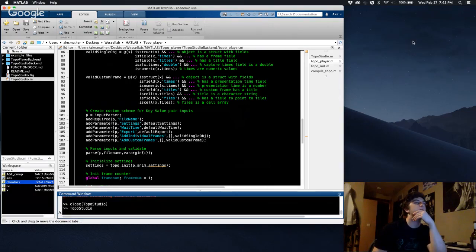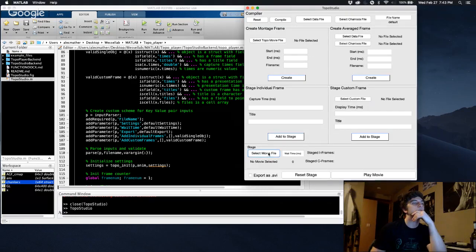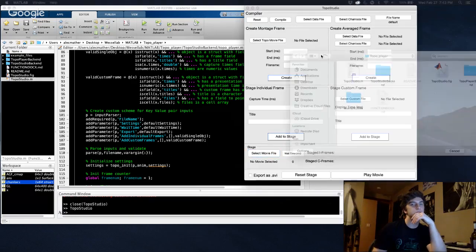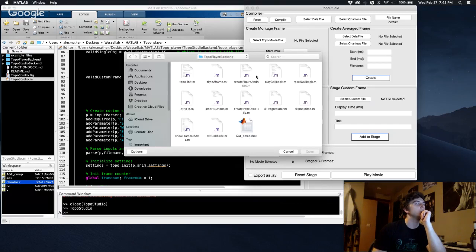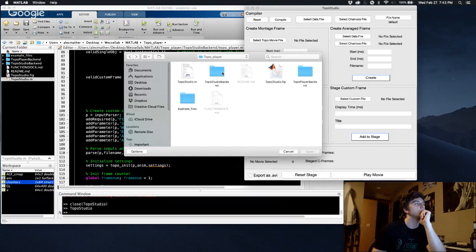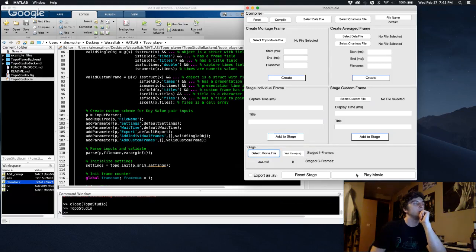Reopen it. Let's grab our movie. I gotta just move this thing. Where did I put it? Okay.